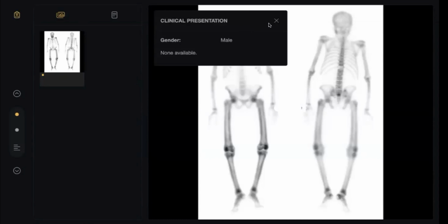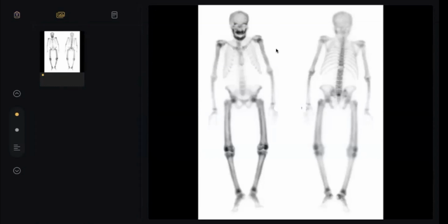Assalamu alaikum, sir. This is an adult male patient presented with generalized bone ache. These are two images, frontal and posterior view of a bone scan in an adult male patient, in which I can appreciate that there is bilateral symmetrical periosteal uptake along both sides of the tibia, fibula, and femoral region, in both the anterior and posterior views. Also, there is no uptake in the kidneys. So I believe that this is a super scan.